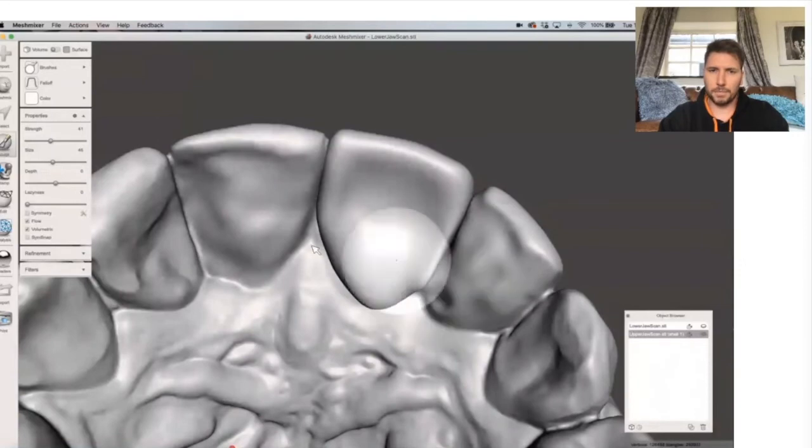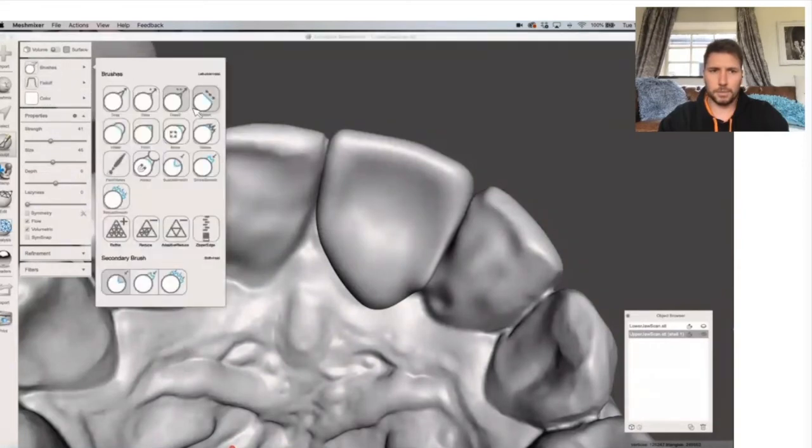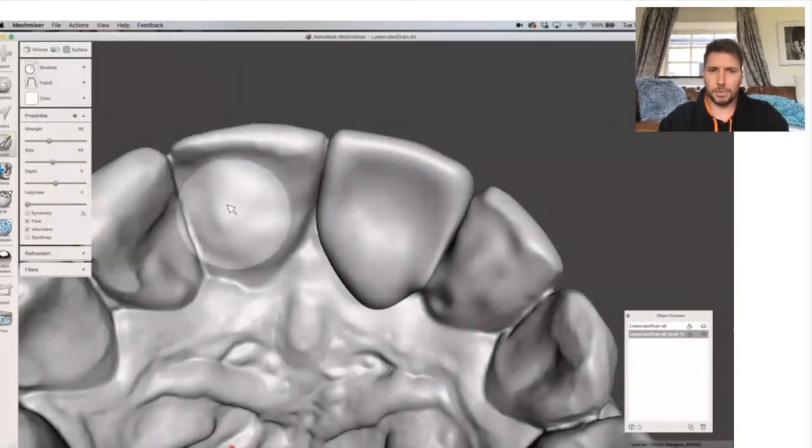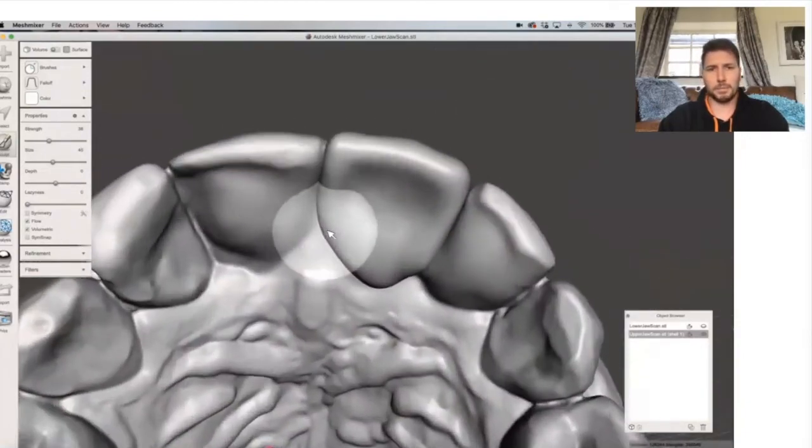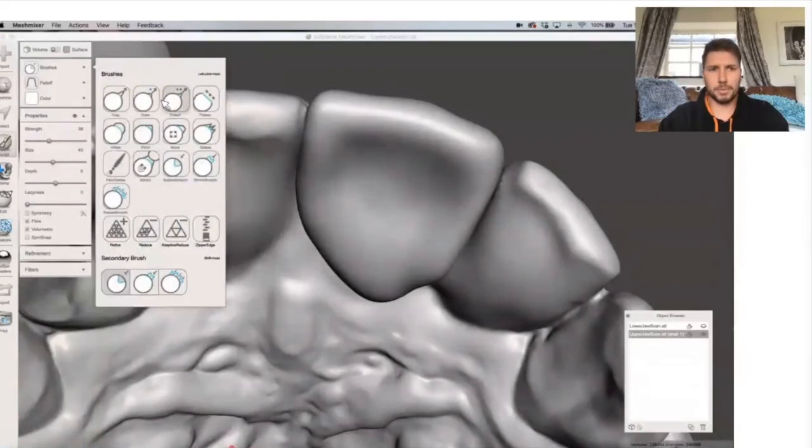I might be thinking, but isn't that going to affect the occlusion too? Against that. So I'm going to put all smooth now. Make sure that's nice and smooth. Smooth it off in between a little bit. There we go. Okay. So now we've built those up a little bit. Maybe might build that up a little bit more in between.